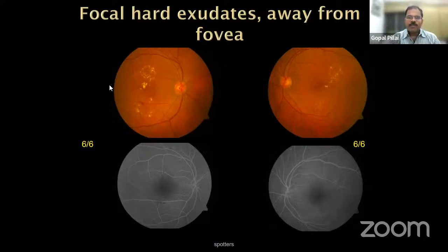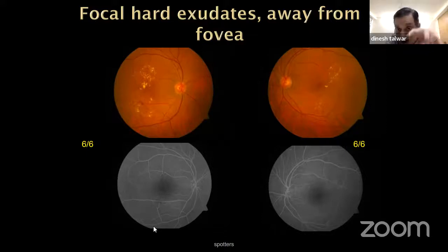In other words? Yes. So I think we discussed this last time actually. So severe and very severe, the definition would be based on the 4-2-1 rule, right? So can somebody tell us the rule, Netra? Okay, so the basic point is that actually you can't call this severe NPDR on this photograph. You're saying NPDR, but you can't say which grade of NPDR. So this is number one.